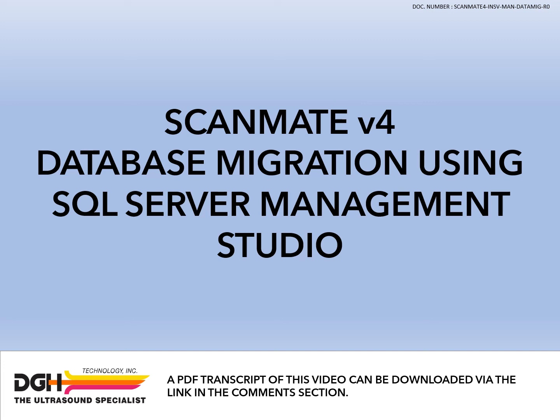This instructional video explains how to migrate a Scanmate version 4 database using SQL Server Management Studio. A PDF transcript of this video can be downloaded via the link in the comments section.